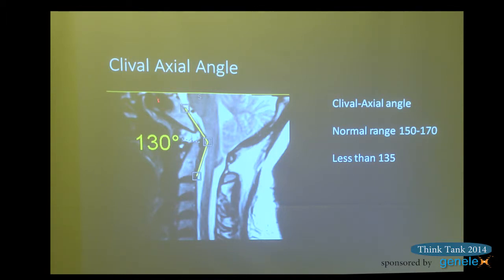This person has, this is the clivus, this is the odontoid, or the first part of the cervical spine, and we're looking at the angulation, or how the bones articulate. And the implication is that the brainstem is draped across the odontoid, or a piece of the clivus and the odontoid. The understanding is that when neural tissue is dragged across, when there's stress across it, the nerves just don't work. And repeat stress, repeat injuries result in long-term neural death and dysfunction.